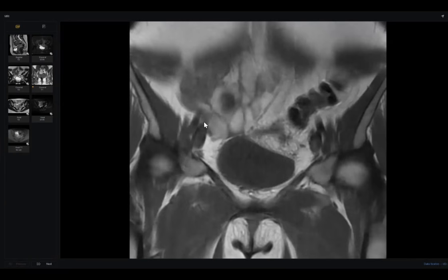Can I have a look here? Look in this slice, please. What happened in this slide here? Can you scroll these few adjacent slices specifically?